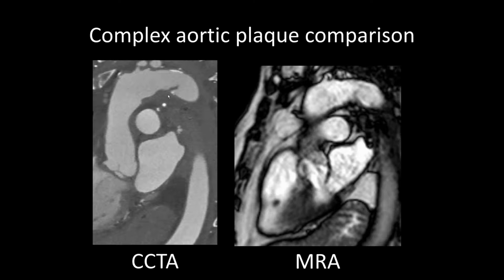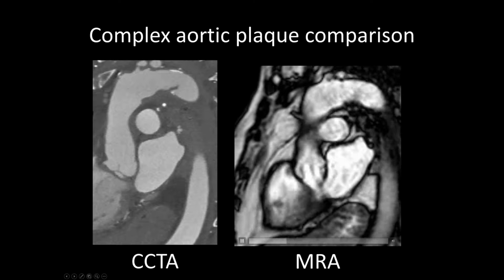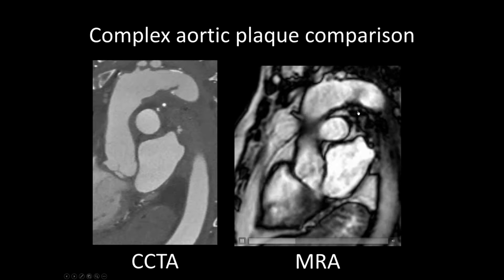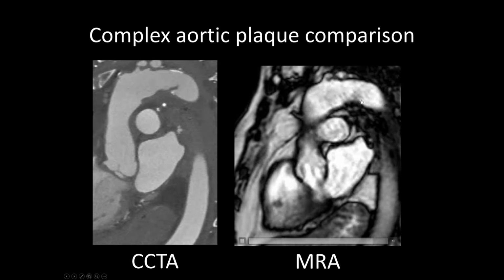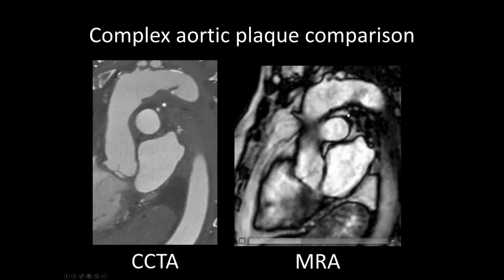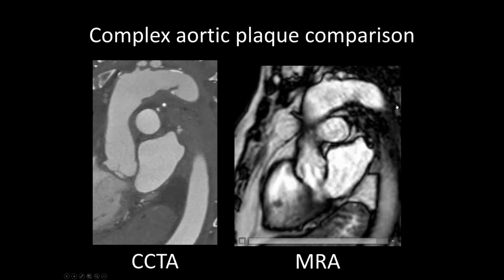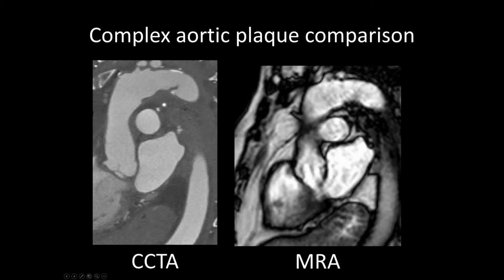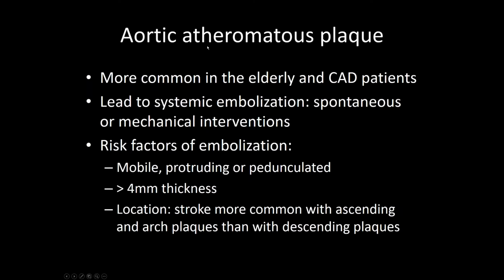Here's another look at it. You can see from our CCTA what it looks like. And it's actually a little bit more disguised here. It's hard to see, but you see some movement here that's actually going on, which is different from just the blood flow. So that then brought us to the question of what to do about this.